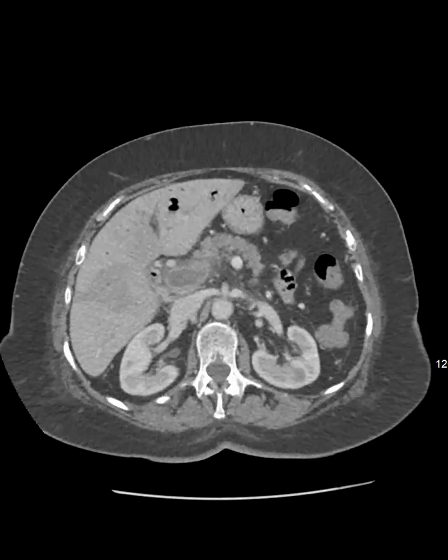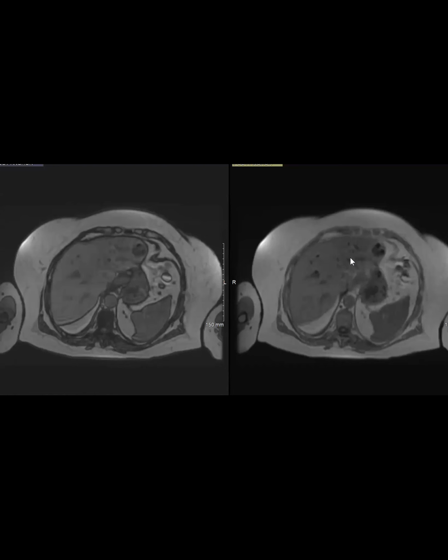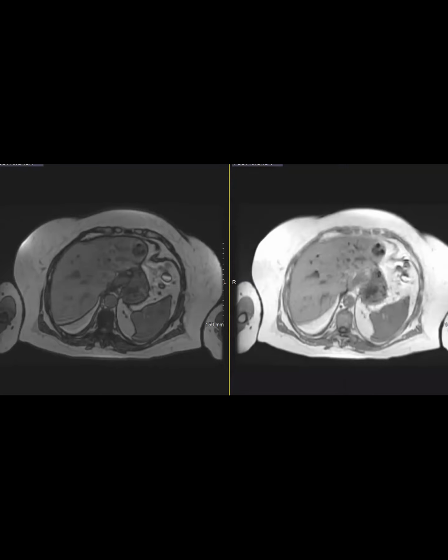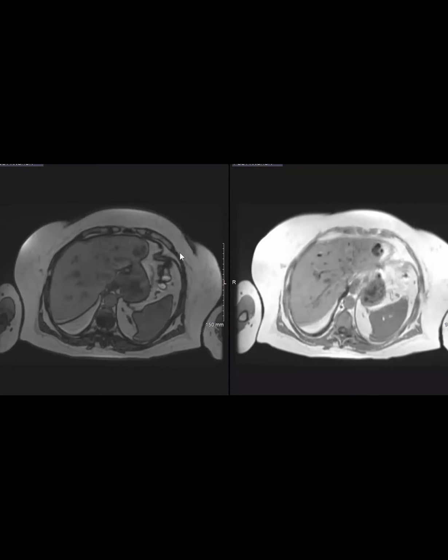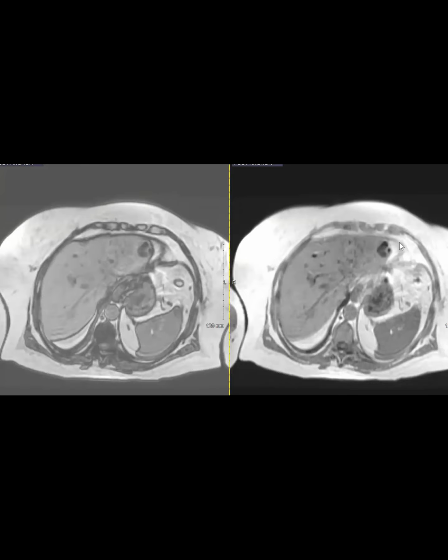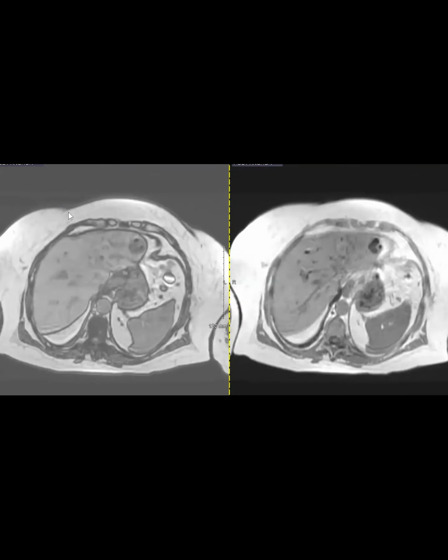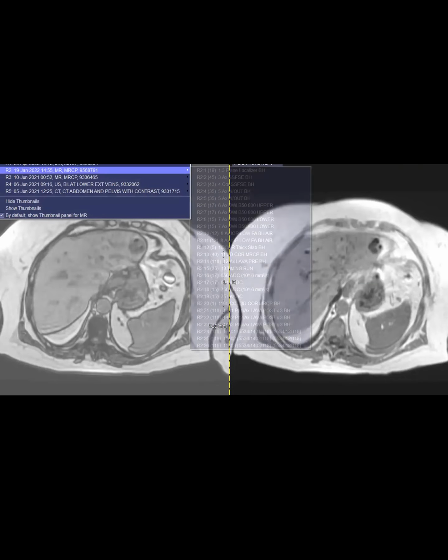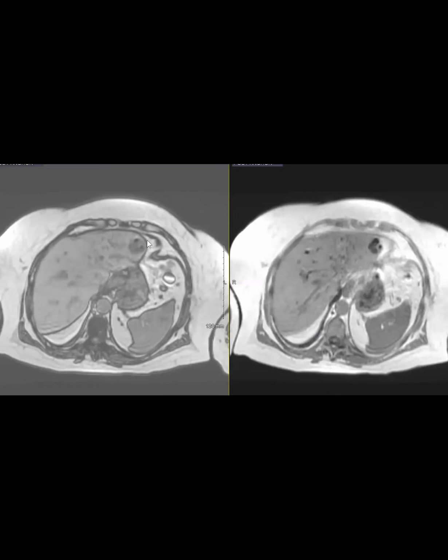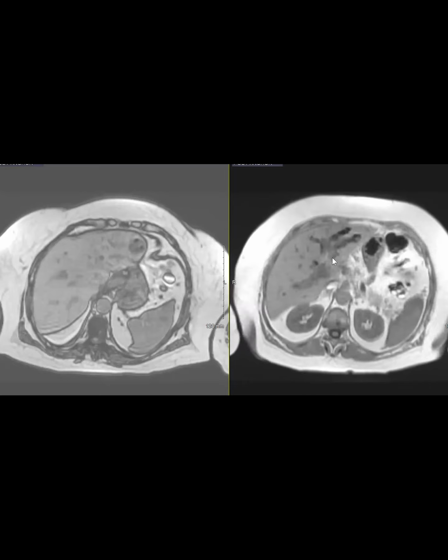And then a few days later, the patient had an MR. Now there's an interesting finding, which wasn't there on CT. You can see that there's air in the abscess. You see that? Now you see the black areas that become a little more pronounced on the second echo. So that's from air. And Victoria, in the setting of a stent, does that mean anything though? Couldn't it just be from the stent? This is an abscess, so you're not right. But it's communicating with the biliary tree.